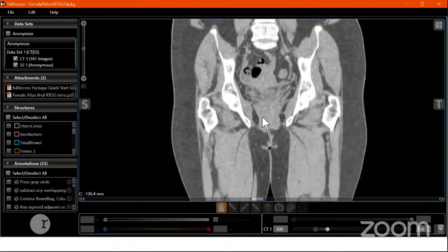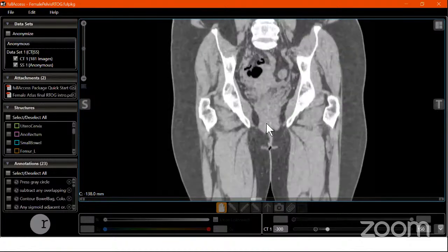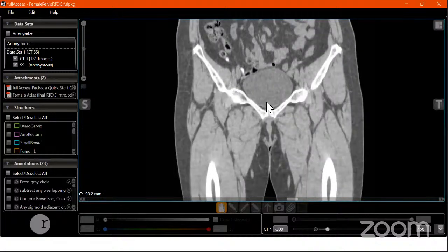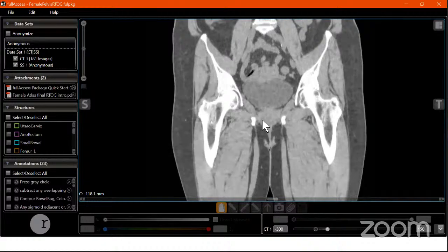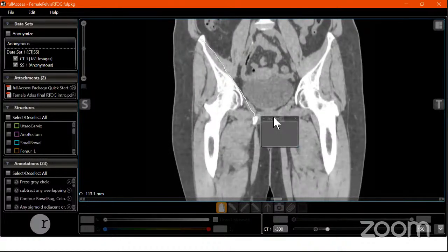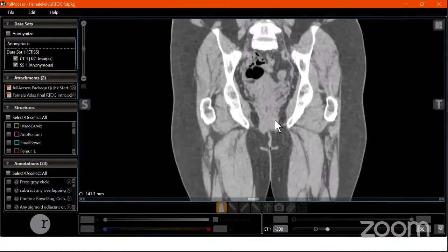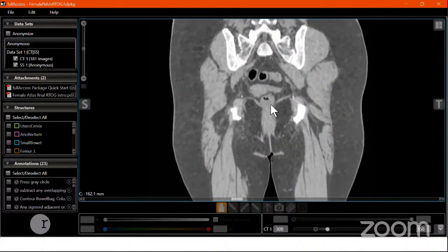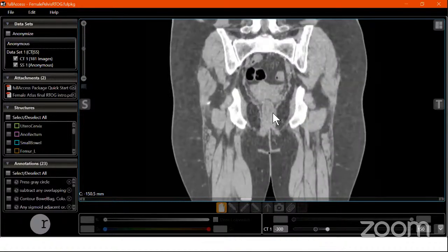All right. So to start with, to have an understanding, let us come to the pubic symphysis level and then go behind, posteriorly. This is the pubic symphysis level. This is the bladder we see. I'm just going from anterior to posterior. As we go down, right behind the pubic symphysis, we expect a cervicovaginal junction. All right, so apparently I have gone down fully now, almost to the entirety. Now I have started seeing rectal spaces also. So let's come back and then stay in the middle.